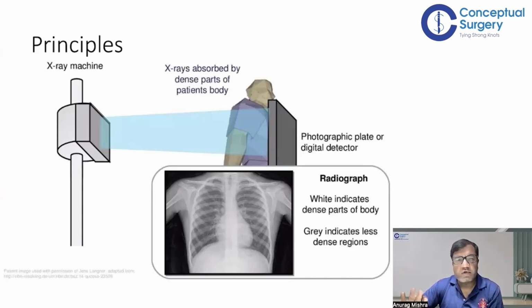So it's like very soft tissue, or empty cavities, or air, that kind of thing. In between all, you'll see various shades of gray. For example, we are seeing here black tissue, then white tissue, then something in between. Here there's a bone which is very white on both sides, but in between the two white parts, at the cortex, the dense part, you can see a slightly grayish tissue. So we can imagine that there is something hard, but it has something soft inside. Obviously here we know it's bone, but that is how we will figure out what the structure is.